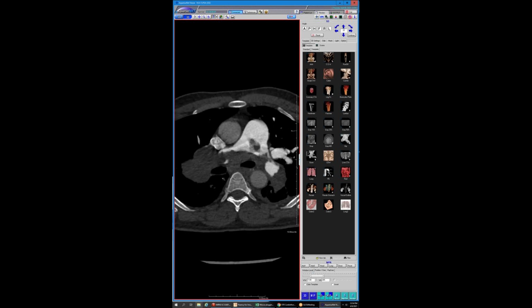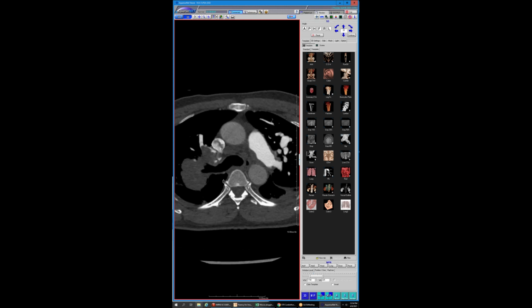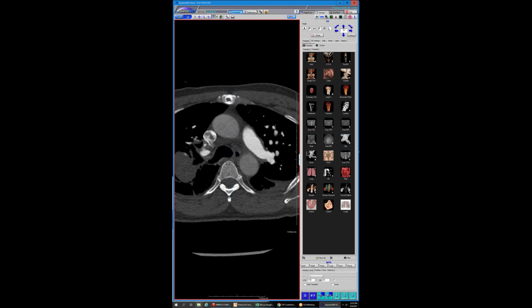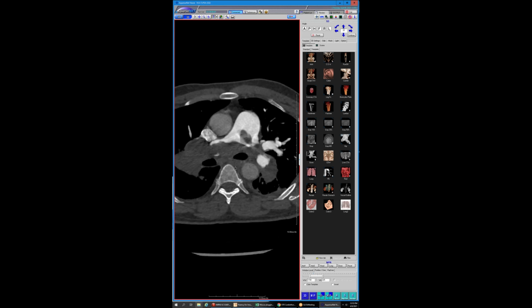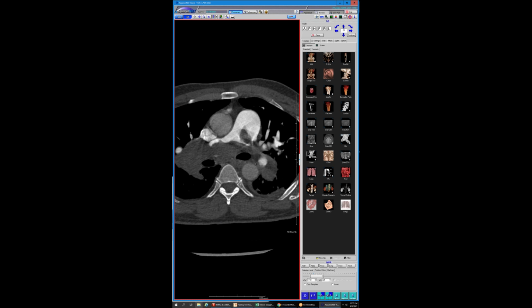You can see that this vessel, he doesn't dramatically expand the vessels. There's vessels actually coursing through the mass, and you will see some areas that are occluded. This is going to be all tumor. The interesting thing about this one, I have to say, of the 50 or something, maybe close to 60 I've looked at now, I haven't seen one. This is the first one I've seen really crawl across midline.